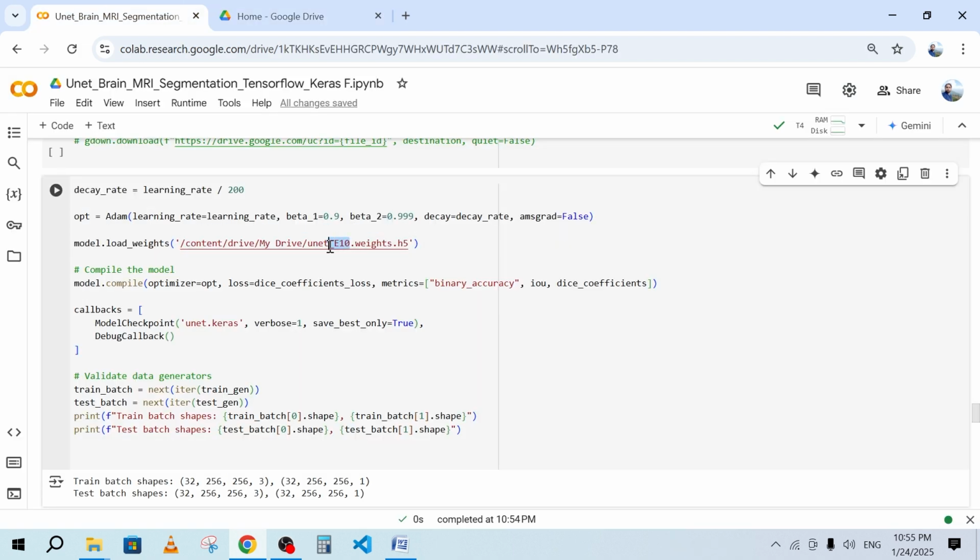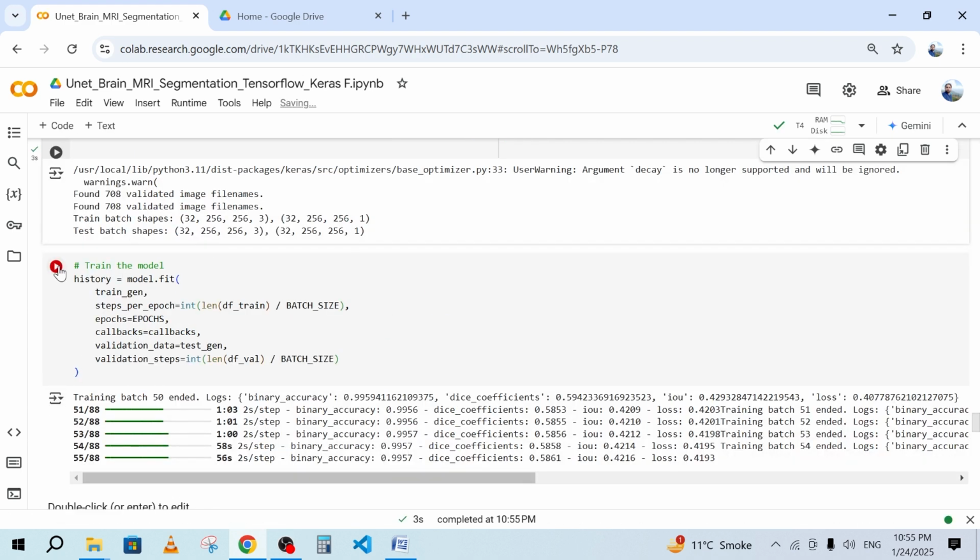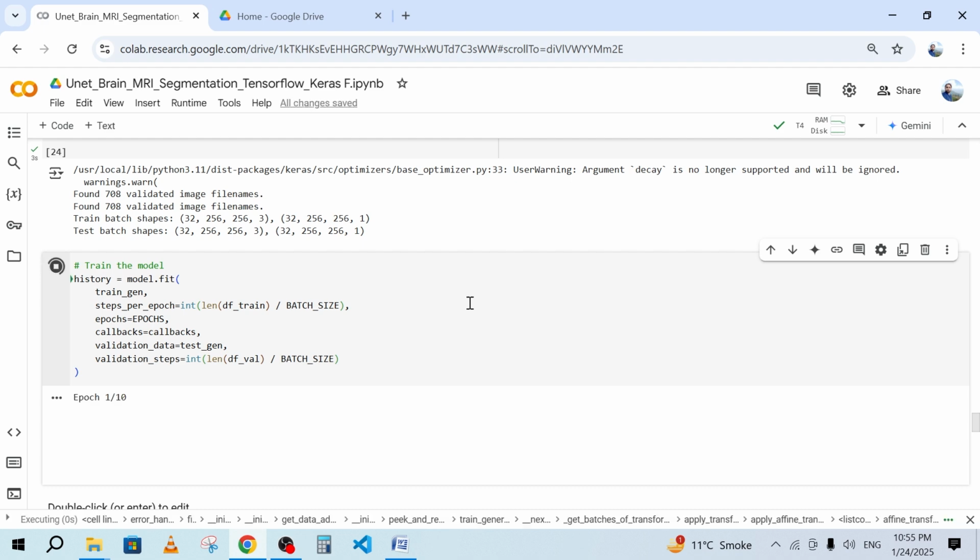Here I will change the name to UNet 90. Let's run this.